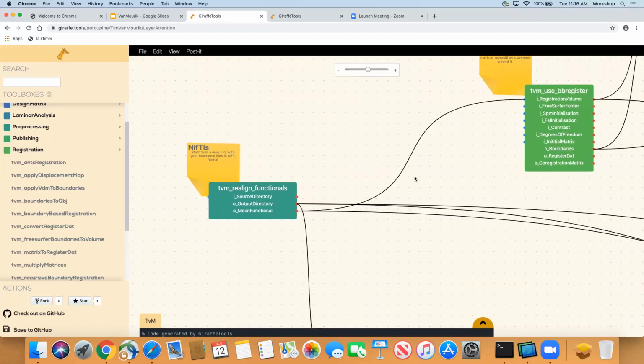So, because when we hit the little red dot, MATLAB asks us if we'd like to change to the folder or add to the path. People have made both choices. It's fine. So the thing about the script is that it realizes what path it needs to add for the functions to run, and then it should take care of itself.